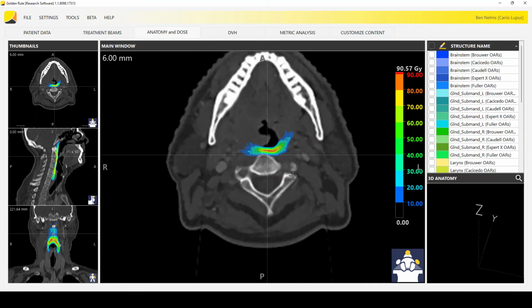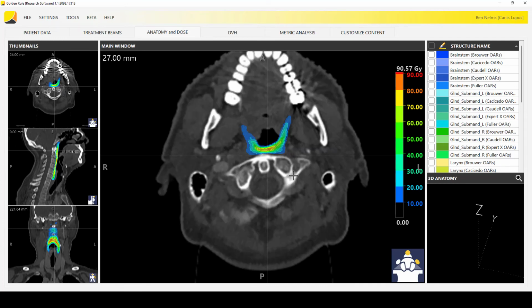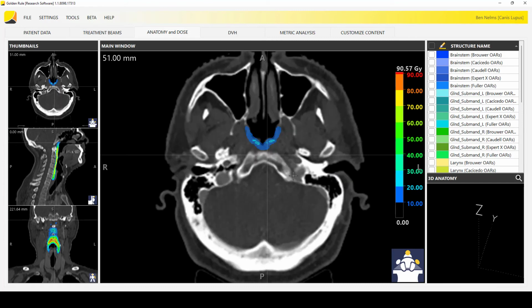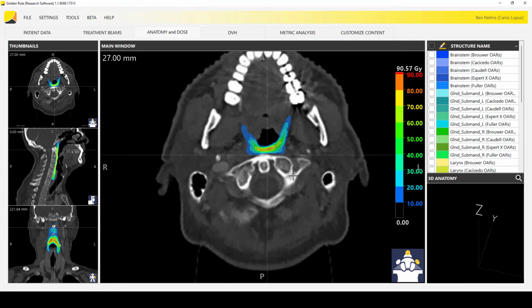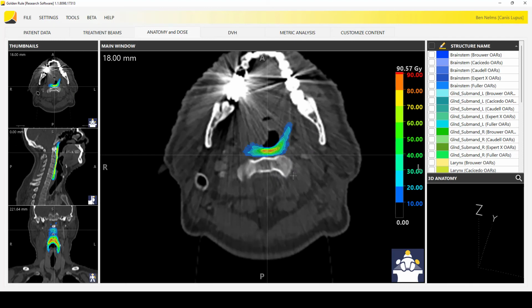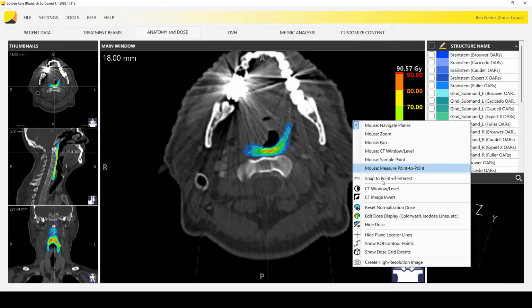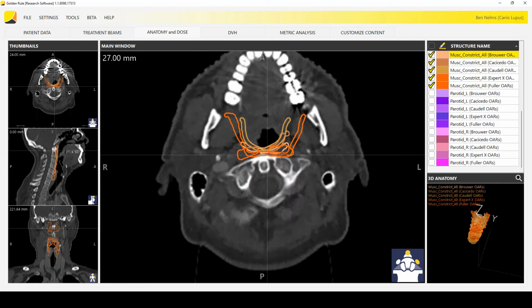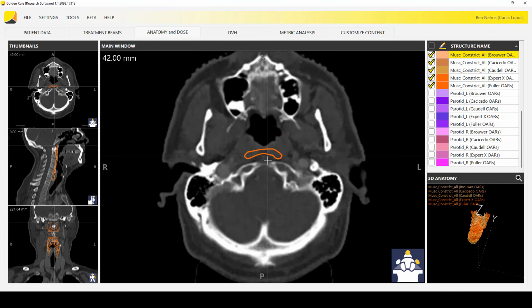Generally, the volume is co-located. That's good, but yeah, so that's the population. Let's turn the experts on. Let's turn the population off. Turn the experts on. Now you can really start to see, okay, we've got a lot of variation in the experts.